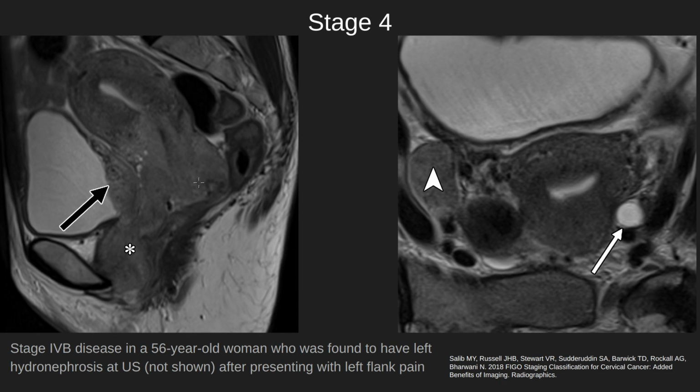Moving forward, stage 4B disease evaluation, we will evaluate the primary mass first. There's this heterogeneous lobulated mass at the level of cervix. It's extending into the endometrial cavity superiorly, and a large mass is extending inferiorly into the vagina right here. And then anteriorly, the tumor is extending into the posterior wall of the urinary bladder. So it's a pretty, locally aggressive disease.